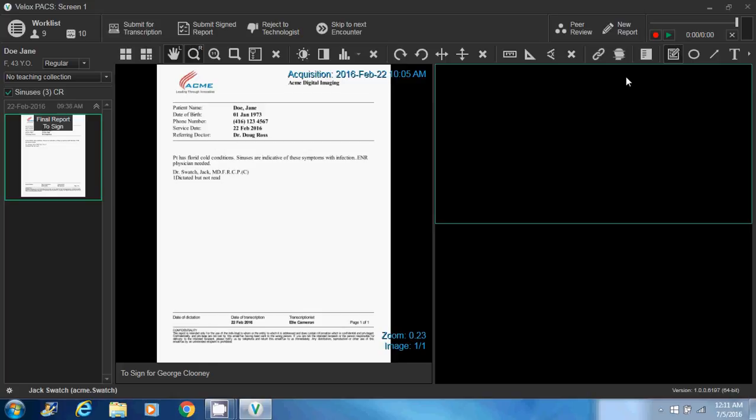You'll also notice the Peer Review tab along the top. This will show you all the cases that are assigned to you that require peer review, and you can open the case and make your grade selection from there. I don't have a list, but you can click on it and you'll see the list, and once you select each case, it will open up and ask you to make your selection.